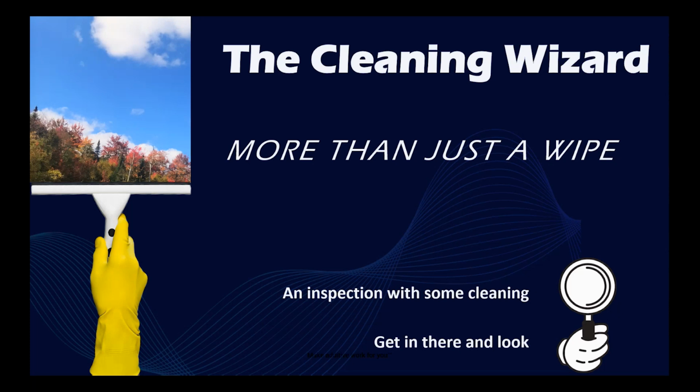because this is a required wizard. And we like to think of it more as an inspection with a little bit of cleaning attached. So at the end of a print, your printer should be very clean, but we want you to get down, get in there, take a look at the heads, take a look at the roller, the wiper blade, the UV, hit them with some IPA, make sure they're spotless.